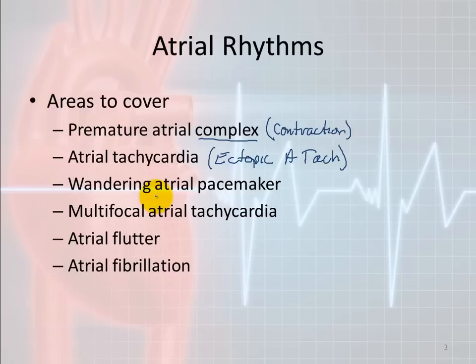The next thing we're going to talk about is a wandering atrial pacer. We're going to talk about a multifocal atrial tachycardia, and these two are very similar, and you'll find that out in the video. We're going to talk about atrial flutter and where that comes from and how you identify that, and of course atrial fibrillation.